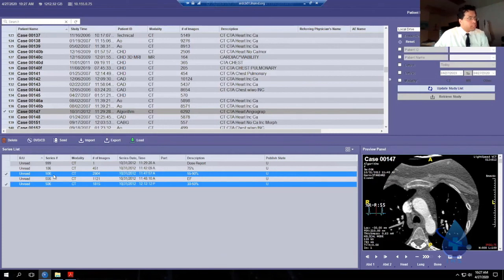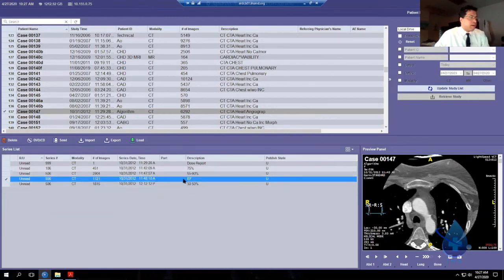On this course, many of the coronaries are labeled 506. That's a meaningless number. It just happens to be that the scanner I used at the time for many years labeled them 506, and it labels the ejection fraction part of the data set with a 556. But the better way is to look down at the baby window and see what the slice thickness is and see what the percentages of the R to R interval are.